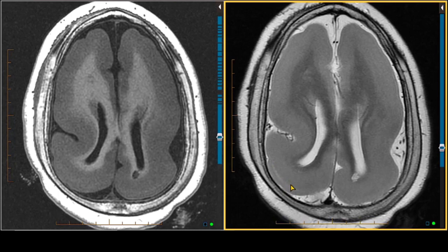It is what's called the cell sparse zone. Then beneath that is an additional band of gray matter. That band of gray matter follows the surface of the brain throughout both cerebral hemispheres. This deeper gray matter that's in a band-like configuration is not in the normal location, so it's called heterotopic gray matter. This pattern of heterotopic gray matter is called band heterotopia.